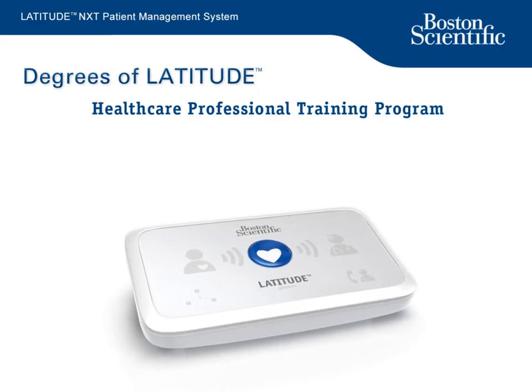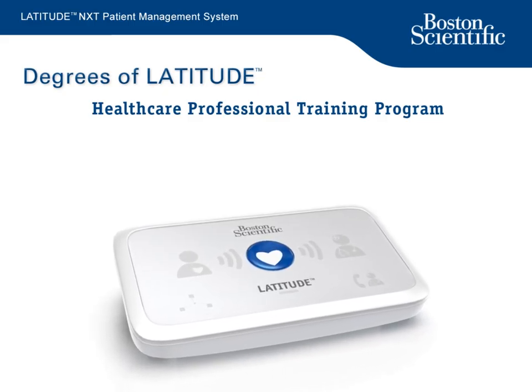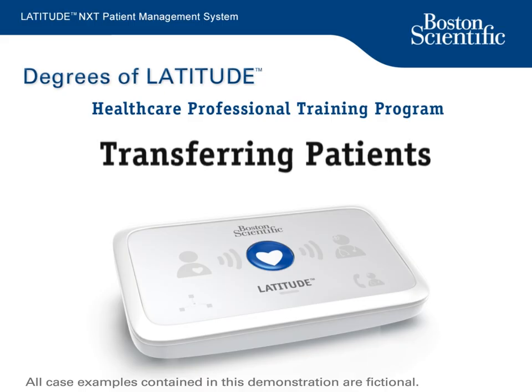The LATITUDE NXT website offers you flexibility and control over how you receive, review, and manage Boston Scientific device and patient data. In this training module, you will learn how to transfer patients in LATITUDE NXT.